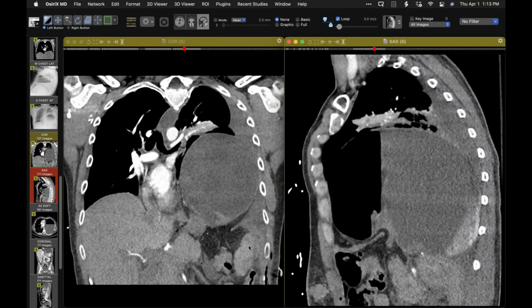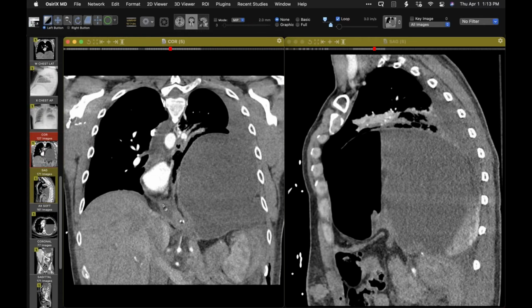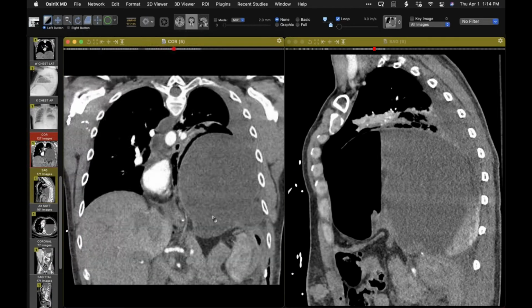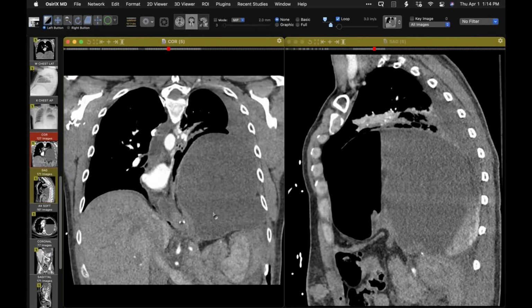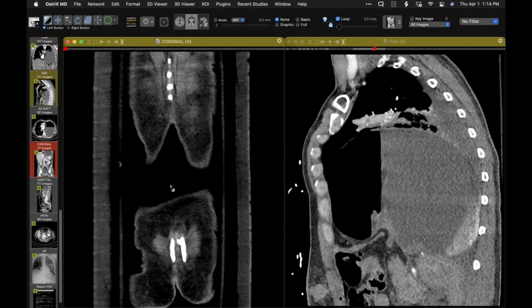So the stomach is very distended. There is not torsion, but there is kind of an angulation here. And at surgery to fix this, they identified some ischemia related to the stomach and had to remove a portion of it as well in the corrective surgery.